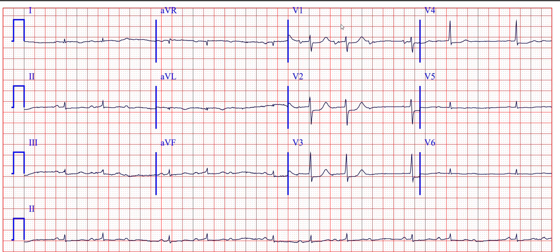This is one of the interesting cases. This picture I have taken from ecg.bidmc.harvard.edu, and I wanted to discuss this ECG because this is one of the interesting cases that fascinated me. So what abnormality can you see grossly till now? You might have observed something.